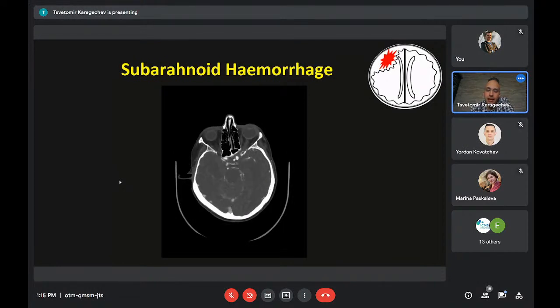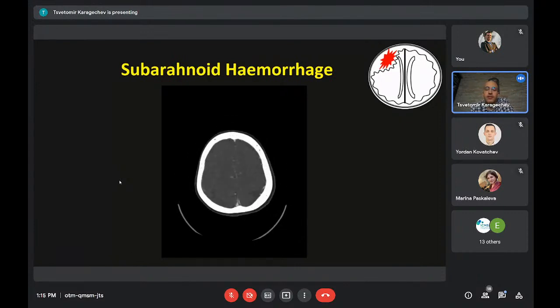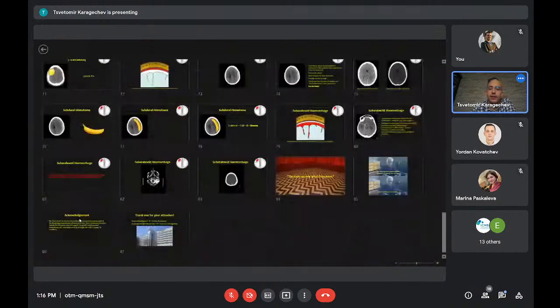And exactly where we saw the hemorrhage, around the circle of Willis, in the basal cisterns, there is this large aneurysm of the right MCA. So this is how CT angio looks like. Oops, sorry about that. Just let me go back to what pertains.